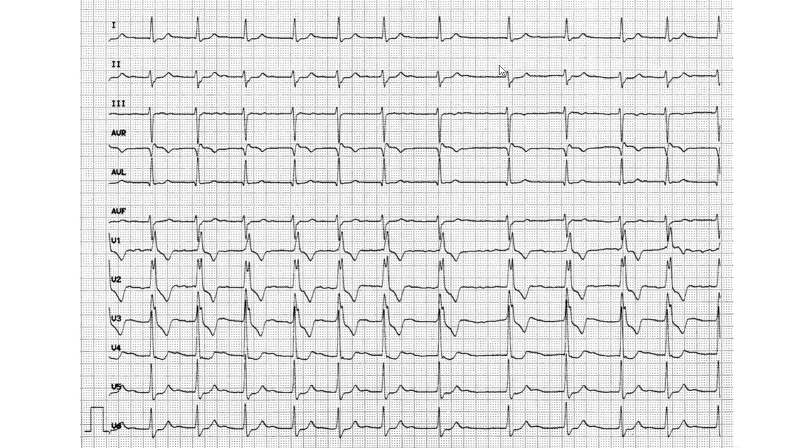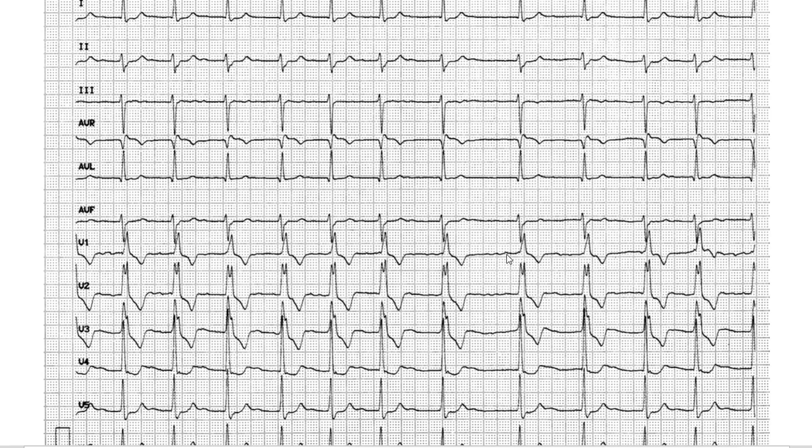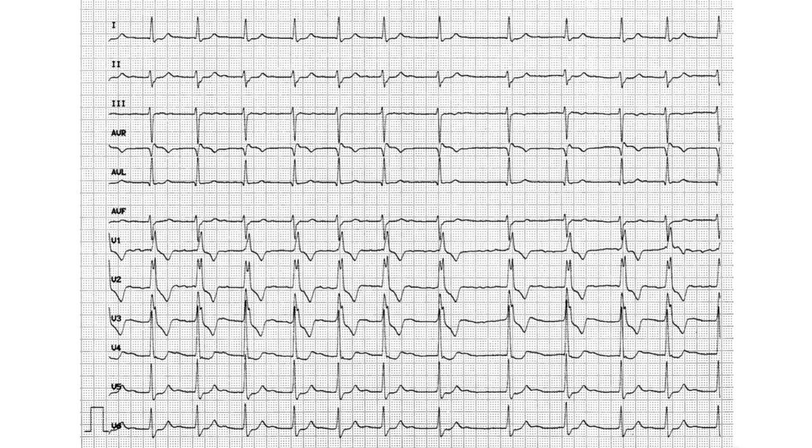Because clearly here I don't see anything. I don't see any P waves. So here, you can clearly tell that this is fibrillation as well. Across all the leads, you can't really say that anything here is a P wave. So that's fibrillation, and very easily we can tell that it's 1, 2, 3. Again, 1, 2, 3. So frequency 1,500 divided by 3 is 500. So that's the fourth point. Fibrillation, frequency of 500 beats per minute. Again, I made a mistake. And don't calculate PQ.